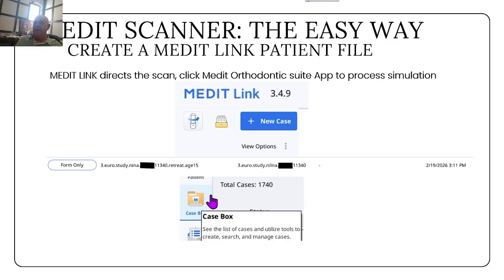So we then make a new case to get it started. We label it and basically create a number or whatever you want for it. And then that goes into your case box, and above here is a patient box.